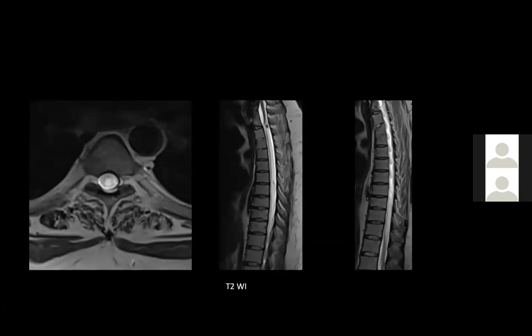So this is classic for NMO, neuromyelitis optica, with atrophy of the bilateral optic nerves and long lesions in the spinal cord and very atypical lesions in the brain. So we signed out as demyelinating disease suggestive of neuromyelitis optica. We suggest clinical evaluation and further confirmation with antibody serology against anti-aquaporin receptors.